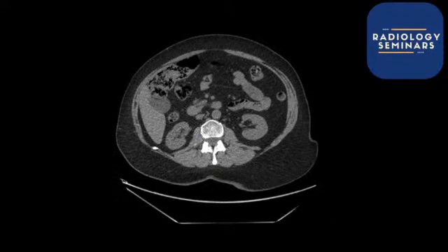So what on earth is causing that pain? What I try and do is, if someone says to me that this patient has right iliac fossa pain, what else could be causing right iliac fossa pain? That's right, the appendix could be causing right iliac fossa pain. So I've got to start thinking along those lines. What else could cause it? A hernia could cause that kind of pain as well. And then in a female patient, they may have some sort of ovarian issue or something like that that can be causing these kinds of pains as well.